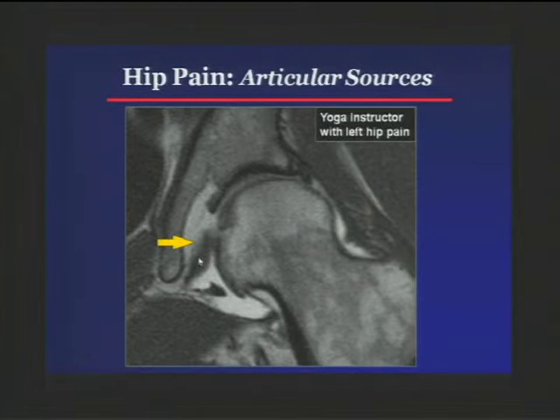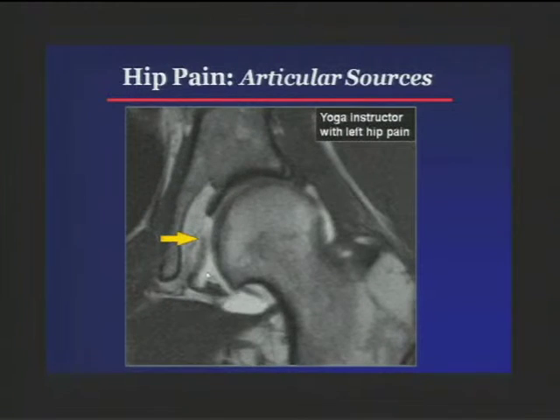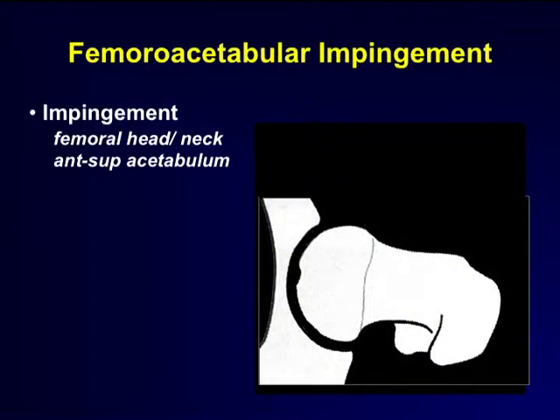If you follow hers, it's markedly thickened, very ill-defined, and it looked like she had at least a partial tear of that, and that's been well described now. They're even describing how they repair these things deep within the hip. So keep an eye on that ligamentum teres.